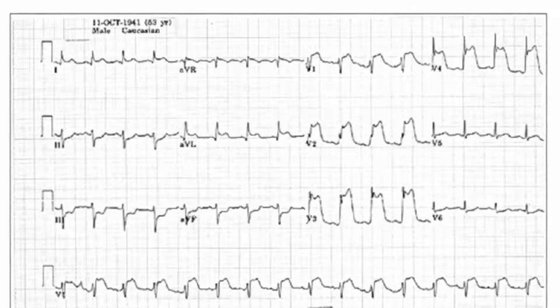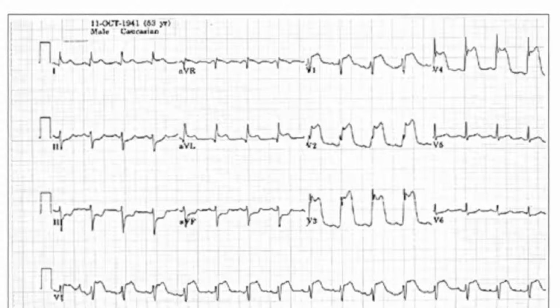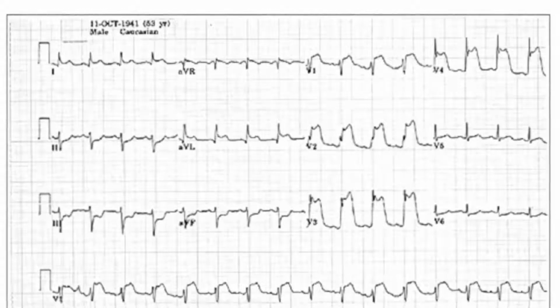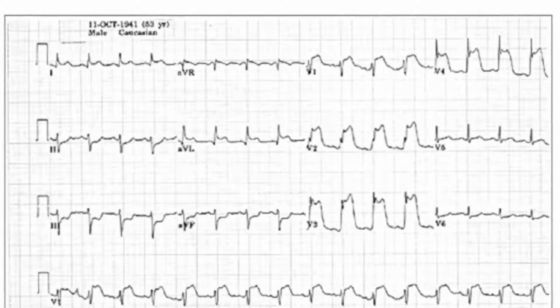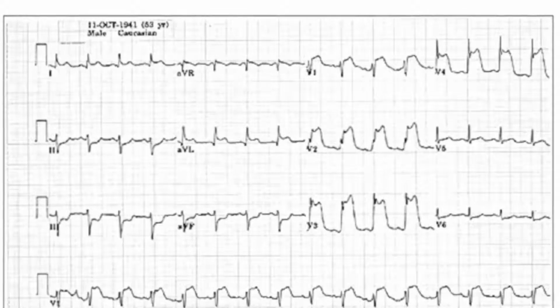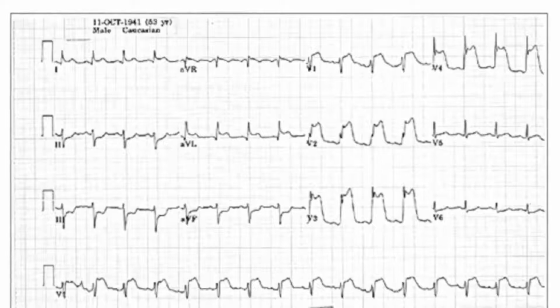And then is there a P wave followed by a QRS? Yes, there is. What's the QRS morphology? Well, it's hard to tell in V1, V2, V3 because they're having a tombstone anterior infarct. So you've got ST elevation there. And you're not going to miss this ST elevation because it's so big, but what also makes it more likely to be ischemia is the fact that you've got reciprocal inferior changes.